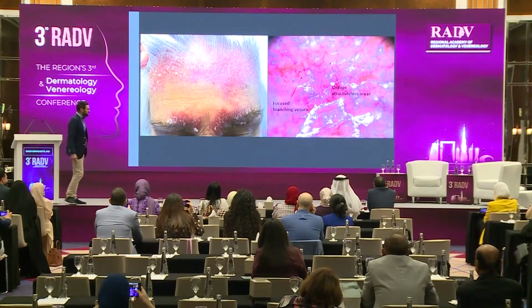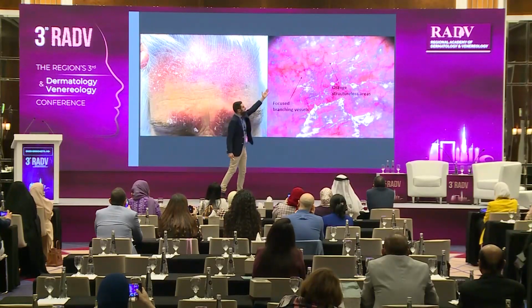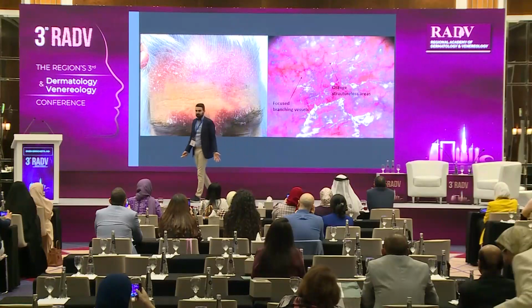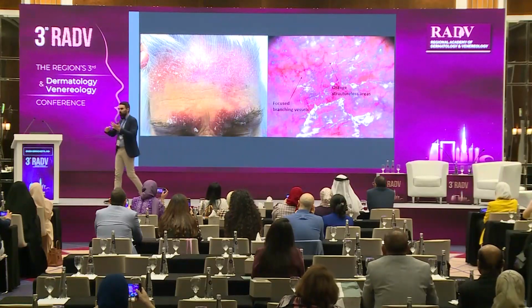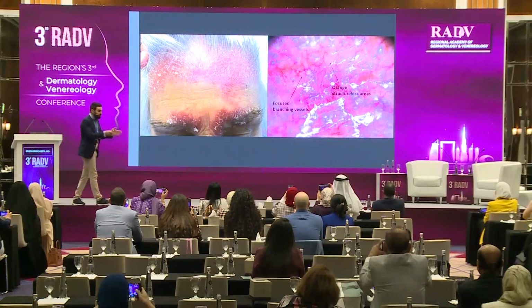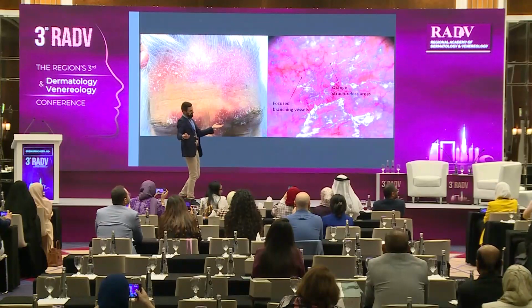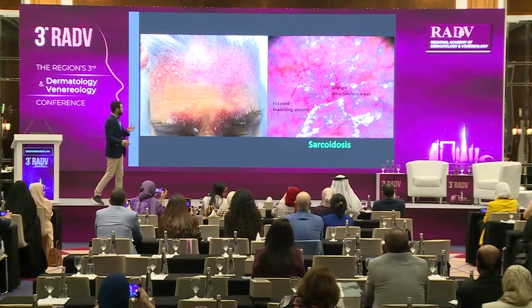Yes, you're right. Because we don't see the dotted vessels of psoriasis. We see orange plus focused branching vessels. You can see that sarcoidosis may look like everything, okay? But on dermoscopy, we always have the same pattern. Yeah, but you are too good. Okay, sarcoidosis.